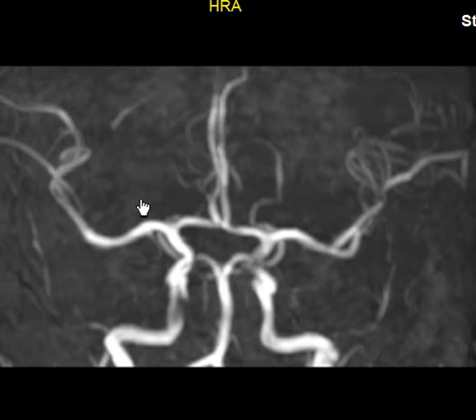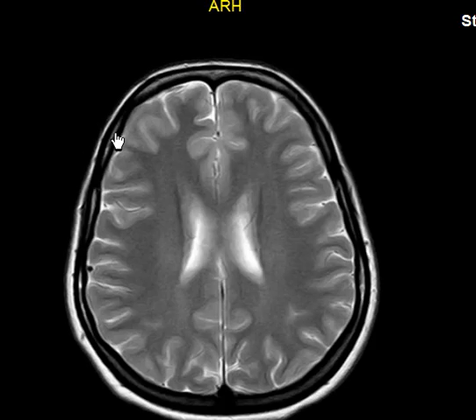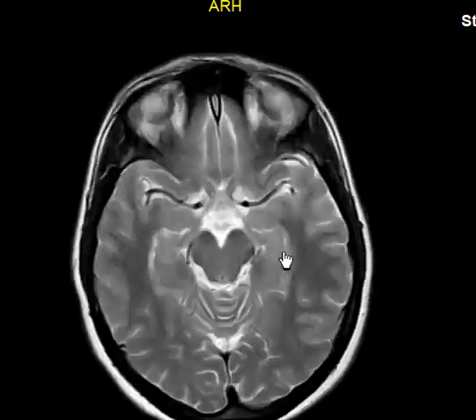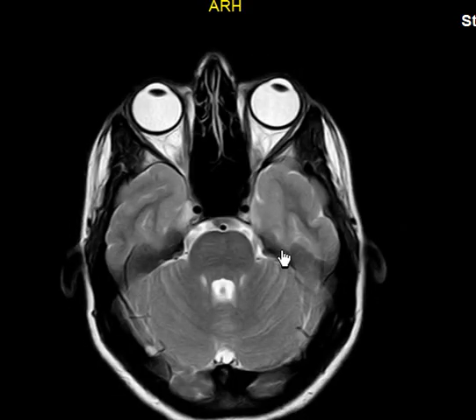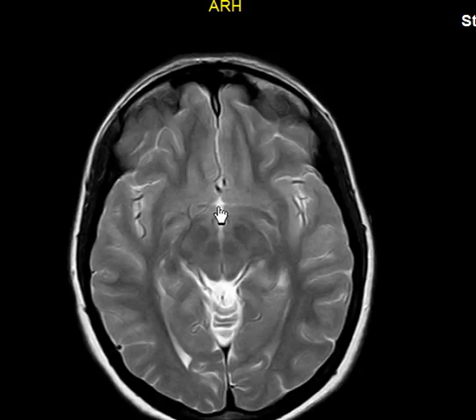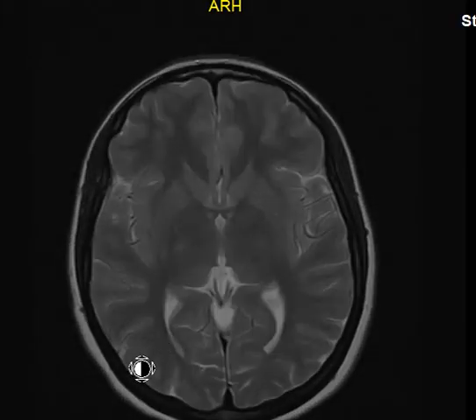Okay? So, what else? Any comments? Anything that anybody wants to know? Where is it located in the brain? Just Dr. Jalal asked about the tectum. Yeah, I don't have the thin cuts to show it here. But anyway, it should be. It was clear on the picture you showed, the red nucleus. Let's try.